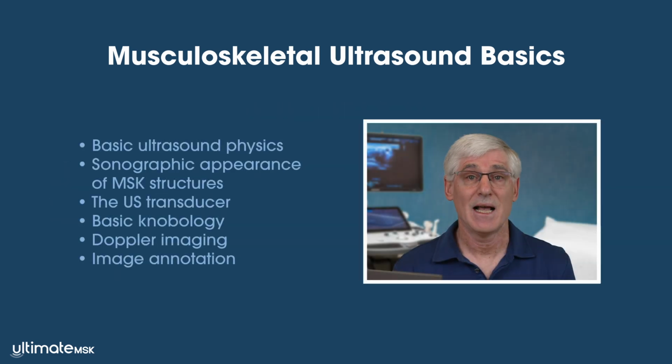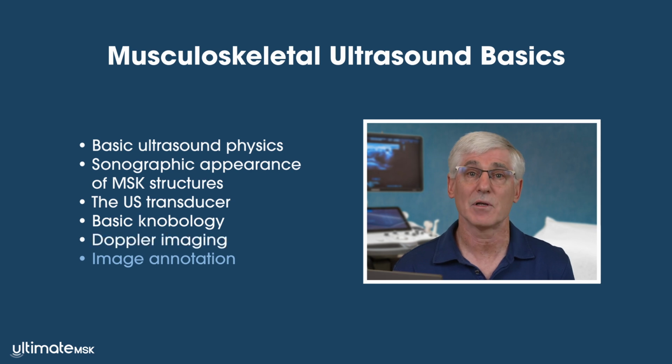In summary, this lesson has covered the basics of ultrasound physics, the echotexture of various musculoskeletal structures, transducer fundamentals, and image optimization techniques, including Doppler imaging. I also briefly discussed image annotation. These foundational principles provide you with the practical knowledge and techniques needed to optimize your musculoskeletal ultrasound examinations effectively.